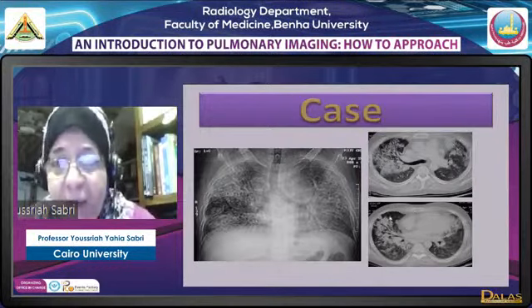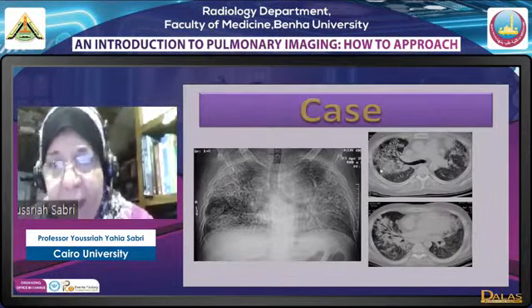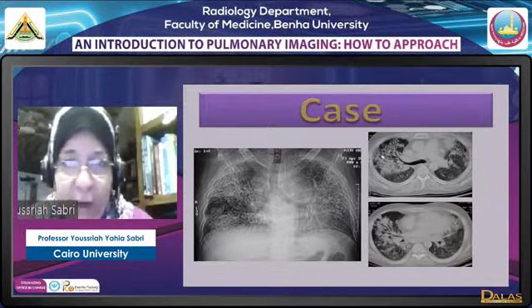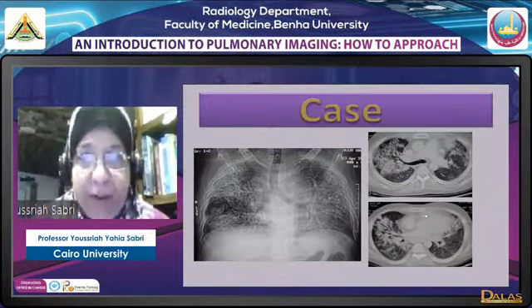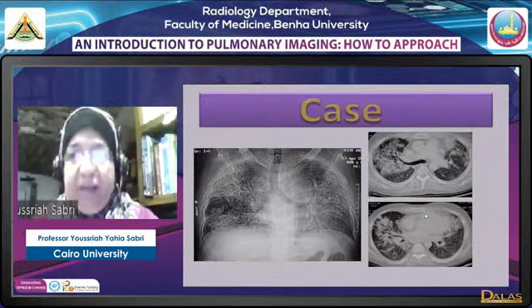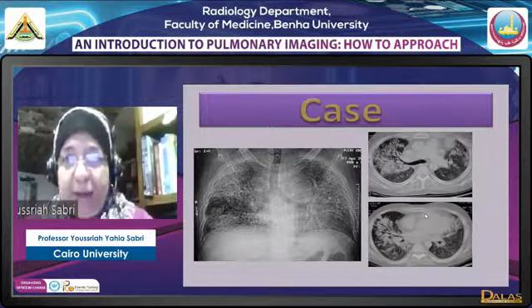What do I mean here by patchy? Where the lesions are peripheral, the lesions are central. We can see air bronchogram, and the lucences within are what we call air alveologram actually. So this patchy diffuse appearance that affects both lungs has a very wide differential diagnosis. Here we must be guided by history.